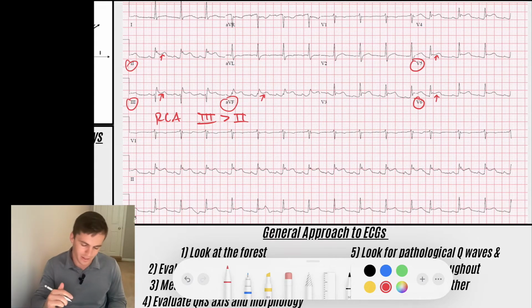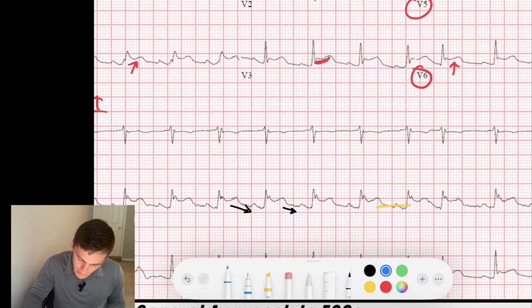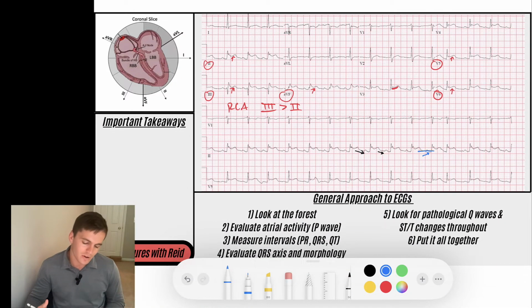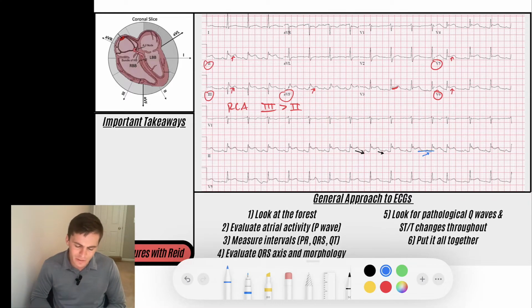So you might think, I wonder if this is pericarditis. And you look and it's pretty diffuse changes. You can see some of that same concave shape. You can see a little bit of that Spodick sign where you've got downsloping TP segments. And maybe even if I drew out the baseline, you would see some PR depression. Right here's my baseline. You can see that PR segment's maybe a little bit depressed. You can see the ST segments are not elevated wildly compared to the T waves, right? Remember that 25% rule. So this is another example of pericarditis.